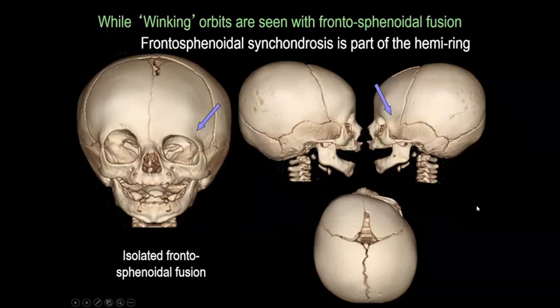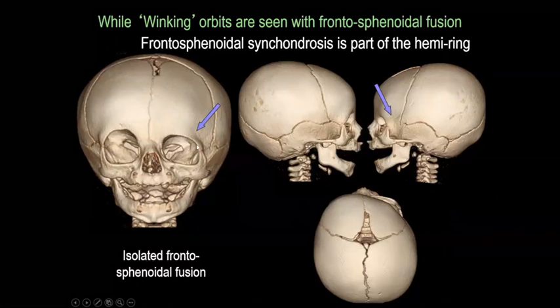Here is isolated frontosphenoidal fusion. So here happens to be that winking orbit instead of harlequin. And you can see here that there is frontosphenoidal synchondrosis. And here is the unfused side.